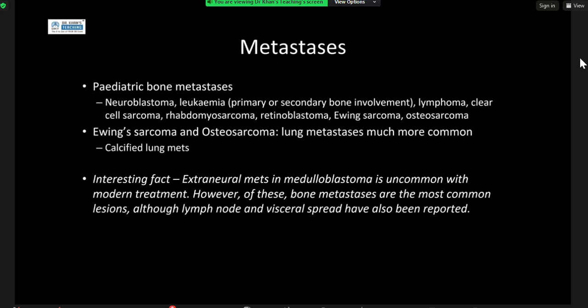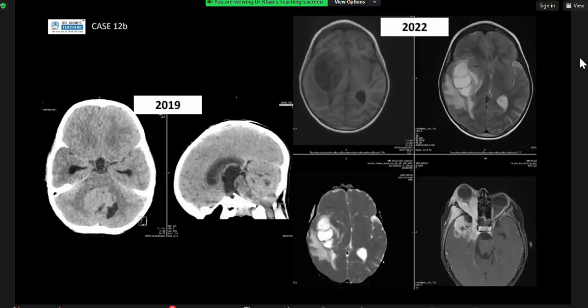And actually for that, it was a medulloblastoma. Yeah, there was a medulloblastoma, and if you go back to the one slide before, in posterior fossa tumors in kids, I know this can be a bit different in adults, but we are doing a pediatric talk. So posterior fossa tumors, it's hyperdense. In the fourth ventricle, the first thing you think of is medulloblastoma.